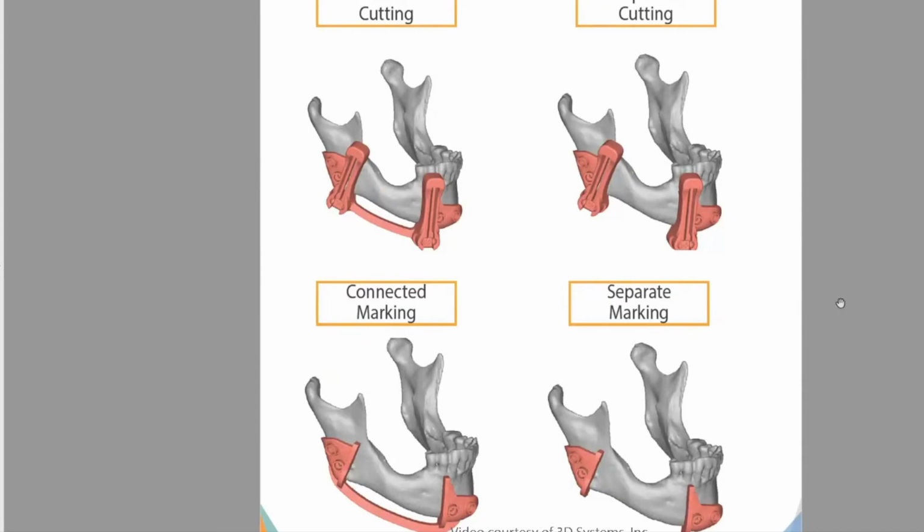So what we have here is on that top row, we would include some slots and some stainless steel inserts that you could use to follow the saw blade, or if you prefer something much more lower profile, for example, for that posterior cut there that's getting a bit high up on the ramus, we have a marking wall option as well. That is, again, as I said, much lower profile and allows for still getting to see some guidance of the osteotomy and the predictive holes in those lower access points.